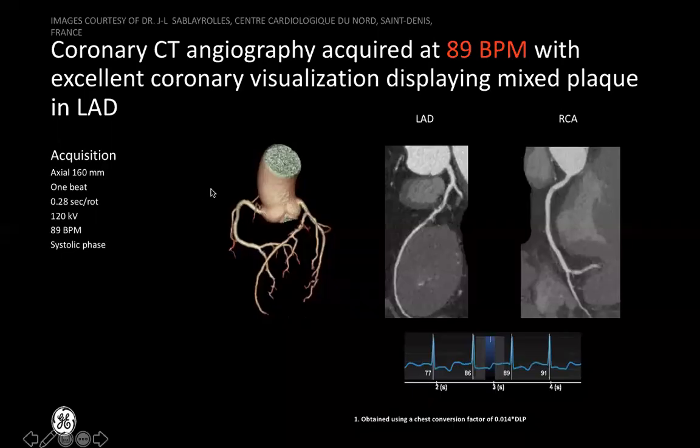One thing that has been fixed about CT in the heart over the last few years is that we can do the entire acquisition in a fraction of a heartbeat, 160 milliseconds. Even if the patient has a high heart rate, here 89, 90, so that heart is humming along. In the old days, this would basically preclude a very good study with CT. But because now the study is obtained in this 160 millisecond window, you get really nice vascular images with these high heart rates. So that problem has been eliminated.